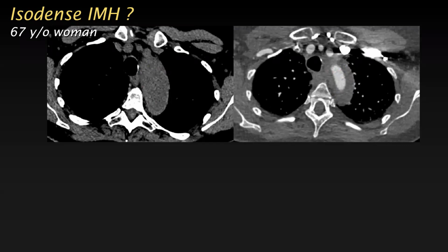So there are a couple of possibilities. So first of all, theoretically, this could be flowing blood, and that just opacifies very late, so it's just not clot yet. But the more likely explanation is that maybe the intramural hematoma is not totally fresh. It could be an older IMH. Another pitfall could be that the patient maybe had some intravenous contrast for, I don't know, a head and neck CT angio or for some other reason a few hours ago, and so the blood is actually not completely low attenuation as it should be.